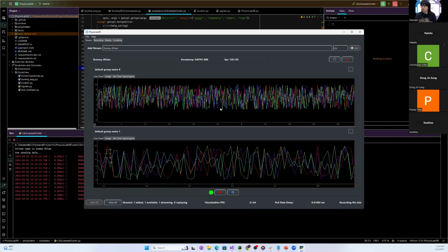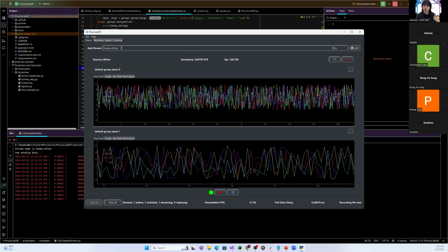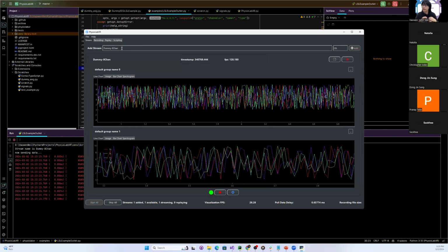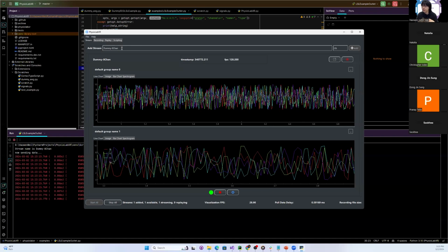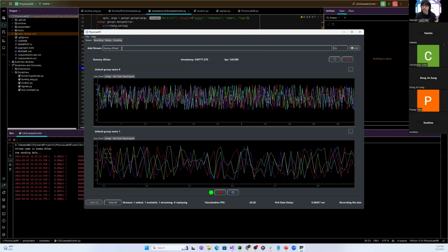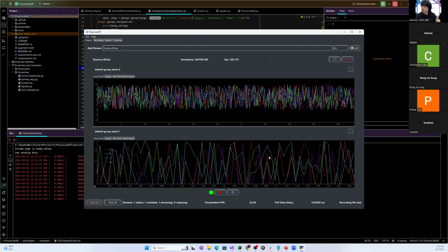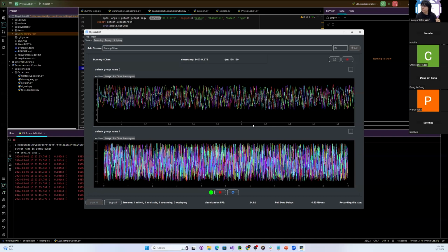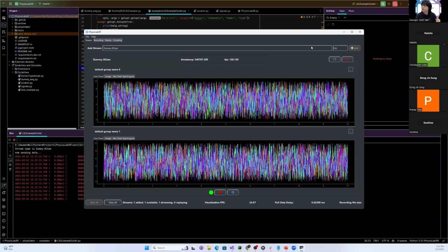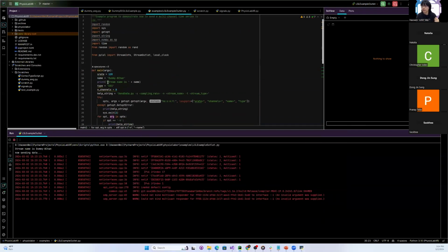So during the hackathon, you won't use a simulated stream. Instead, you will have the real EEG streams from devices like OpenBCI and g.tec. There are some examples. And you can remove the stream with a button click on the top right corner.